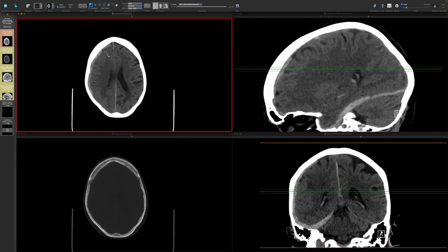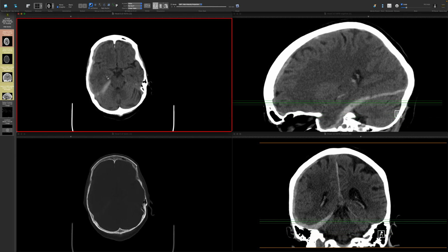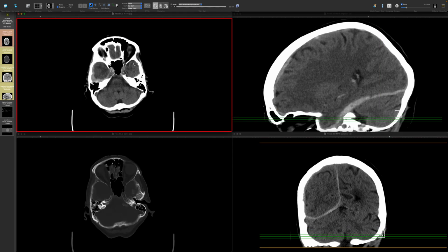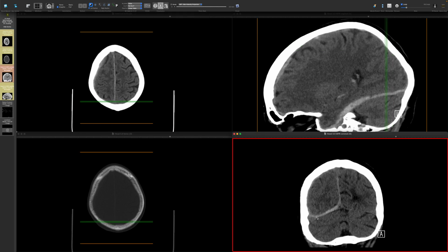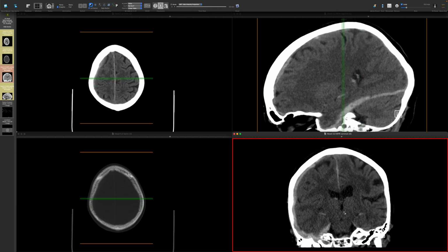on the right side. And you can see that that's overlying portions of the frontal, parietal, and temporal lobes. You can also see that there is subdural hemorrhage tracking along the parafalcine region on the right. You can see this thickening here on the axials and here on the coronals. There is also acute subdural hemorrhage tracking along the right leaflet of the tentorium, which is nicely demonstrated on the coronal image here. This is what the tentorium should normally look like over here on the left side.